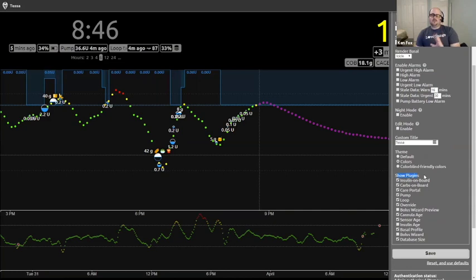So if you have that feature listed in the show plugins section, it will turn this on by default. So when you load this site on any device for the first time, it will turn these on for you. So if you want to set up your thing with everything turned on, if you're like me and you log into Nightscout on like 5 or 6 different devices, or if you're going to hand it out, like we mentioned, you can turn these on so they stay on for that person or anyone that loads your Nightscout site. So if you want Insulin on board to always show, put IOB in the show plugins section. If you want the loop pill to always show, that's a good one. Make sure loop is in there.